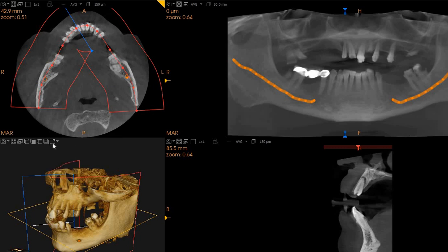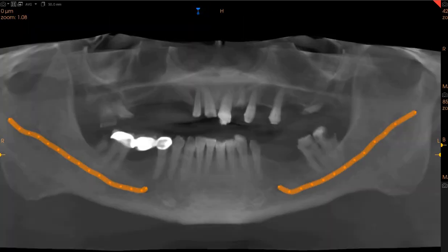This is the CBCT of the patient that you had requested. The area of interest is the upper arch for implant placement. As you can see very clearly here, we've got multiple teeth. Some of them are BDRs. We'll start with the upper right 7 and 8 region.